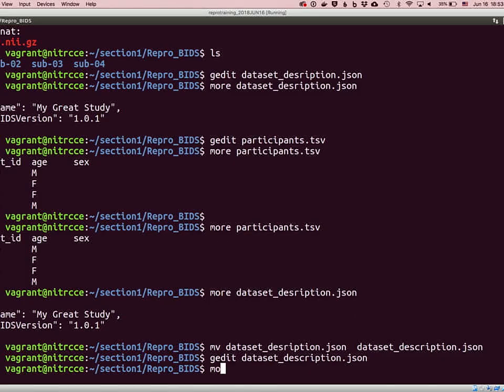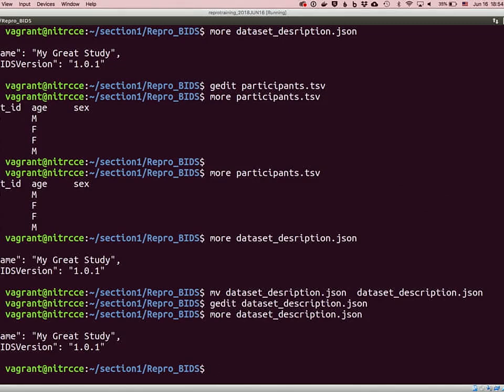Great that you're making some mistakes, but it's capital N for name. It's on the bottom now. All right. Capital N. Don't touch. Yeah, it's down here. Yeah. So capital Name, quotes.